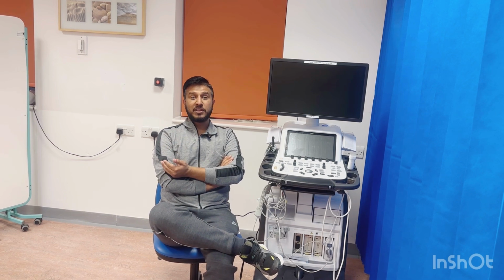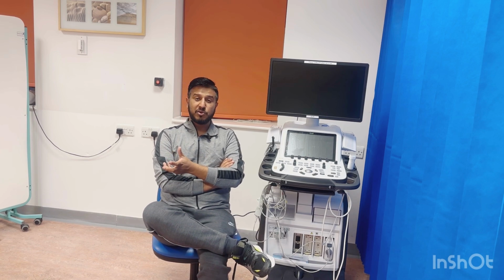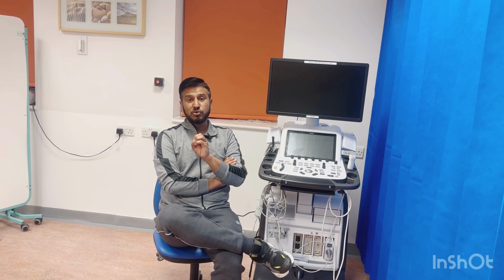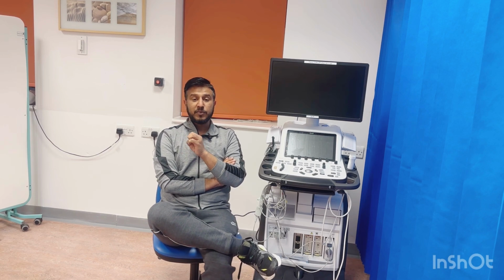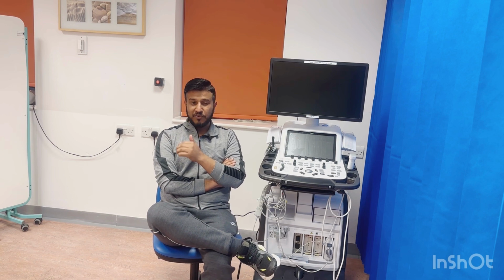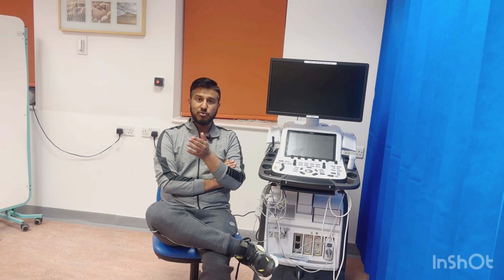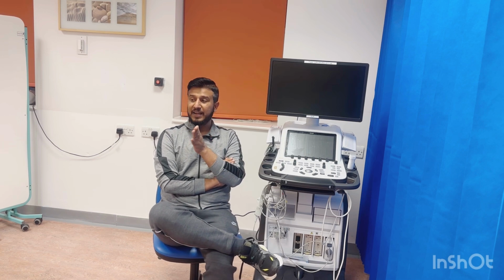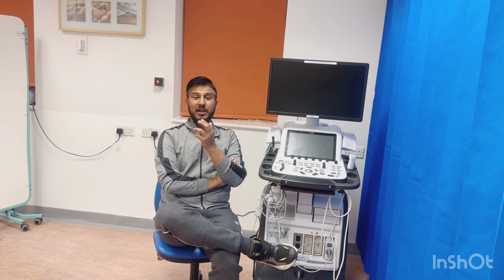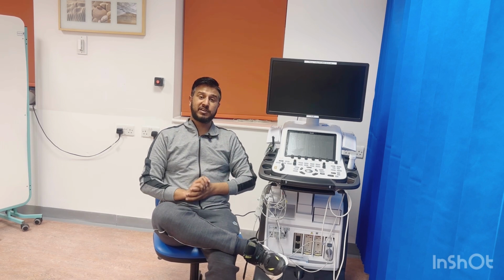how we should look at the aortic valve, what is the anatomy of the aortic valve, something about the aortic root, okay, these things. And then we will also try to go into the quantification of the aortic regurgitation, okay. So different parameters. I will explain you first, like how I used to do, and then I'll show you a presentation in which they will be showing like how we are going to do it, okay. I'll explain you with the presentation as well.